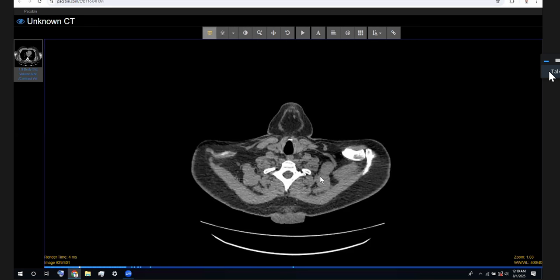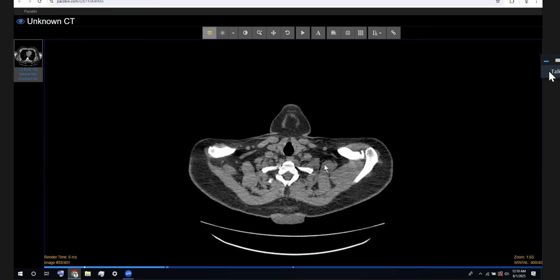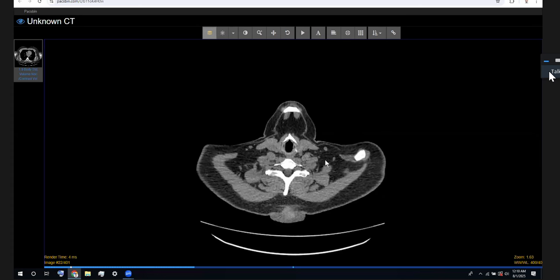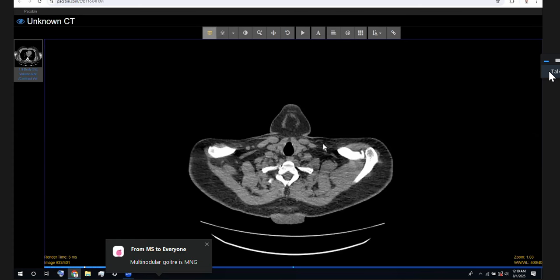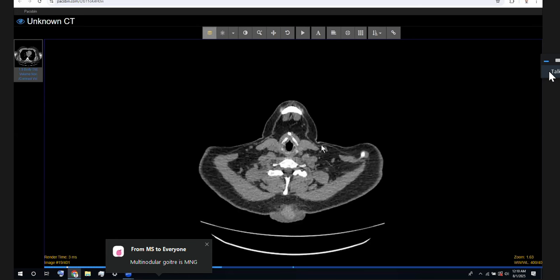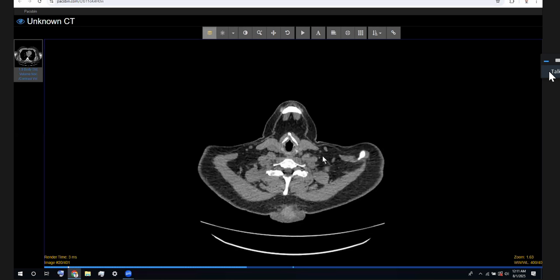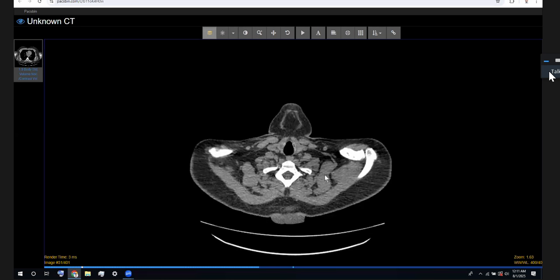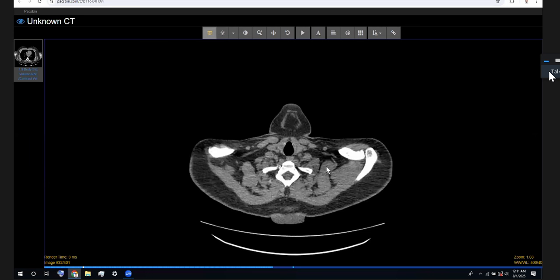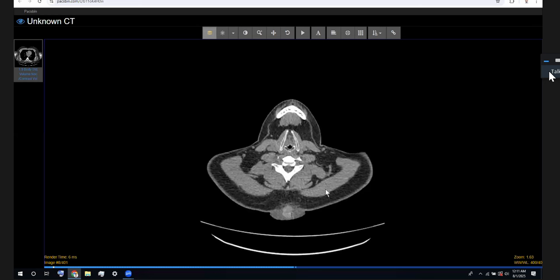The first thing in the scrollable images I can see is right over the cutaneous and subcutaneous plane, in the midline. This lesion has a hypodense component, also some internal hyperdense areas with some surrounding fat stranding. Predominantly this lesion has a cutaneous and subcutaneous center, and there is no lesion in the mediastinum.